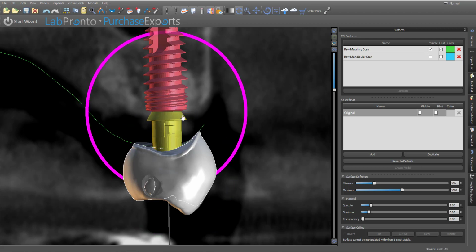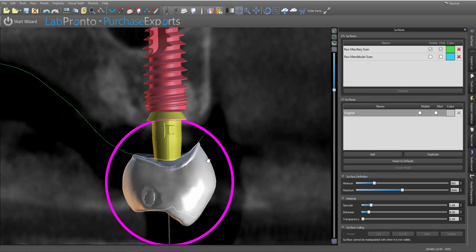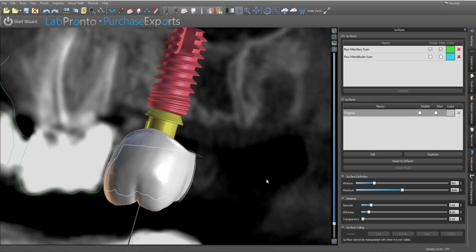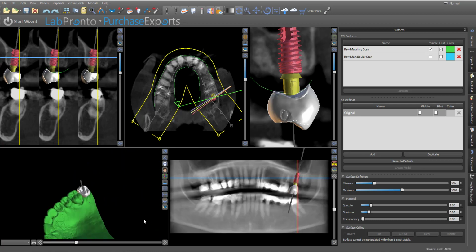Suppose that you were looking at this and it were going to have a tomato on a stick look. Well, that would be an indication for moving your implant maybe more apically, okay, getting a little subcrestal, and then maybe doing some bone profiling so that you can get that nice transition. Okay, but I'll move that back. I like where this is at now. And that's essentially it for the crown down planning. I'll go ahead and make the guide, and I'll show you one other trick. If you wanted to make a temporary ahead of time, then let's go ahead and do that. So I'm going to fast forward this part and just quickly make a guide.